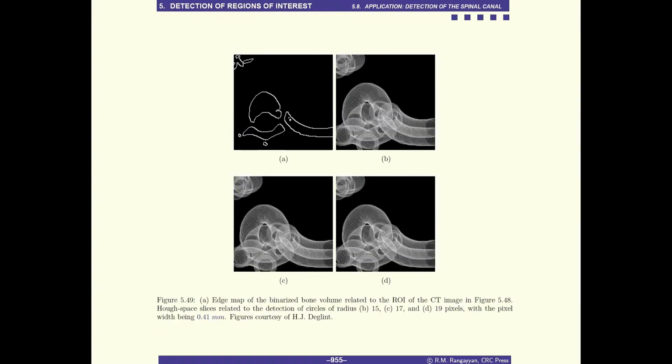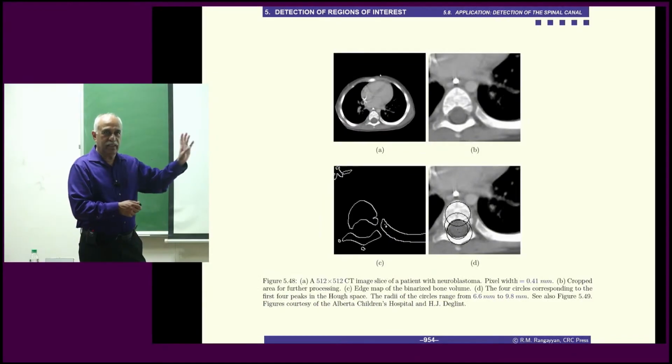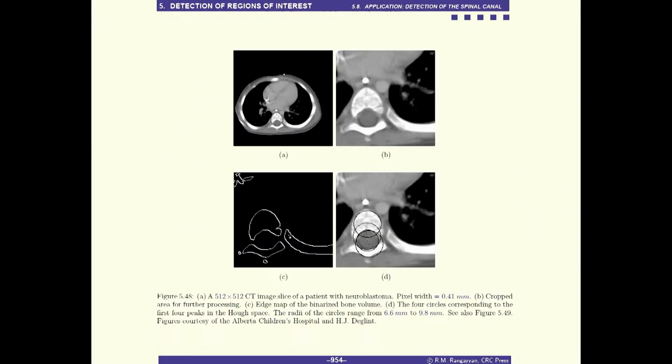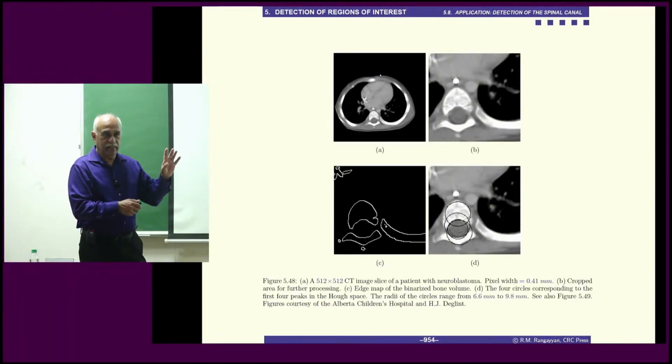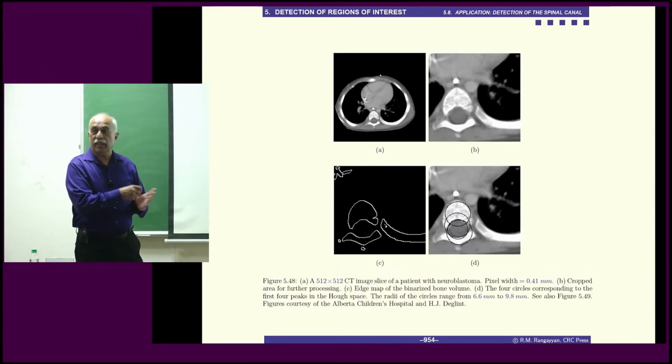In the Hough space, for every point here, you draw a circle of the radius of that parameter slice. So you see all of those. This is for radius 15 pixels, 17, 19 pixels. Not full. Still, there are some 50, 60, maybe 70 pixels there. Here you may have a total of 40 pixels maybe. But that's the circle I want.